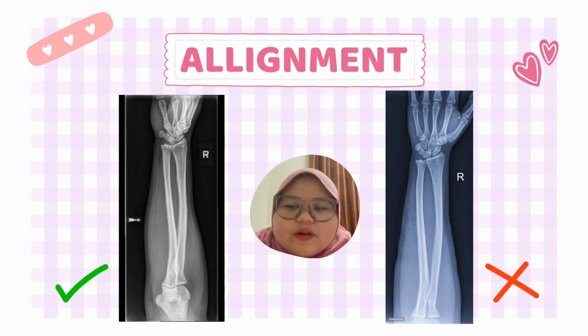The alignment for this radiograph is incorrect as it does not include the olecranon process, olecranon fossa, and distal humerus, where we can assume that when performing this projection, the centering ray is not centered at the mid-shaft of the radius ulna.